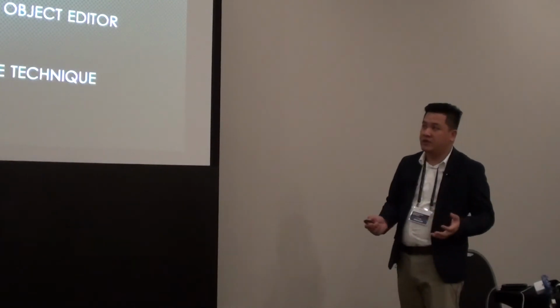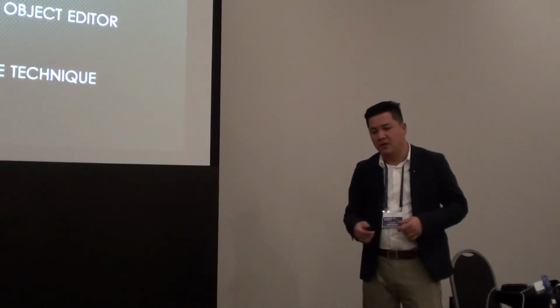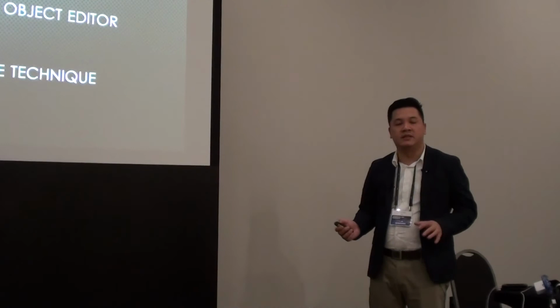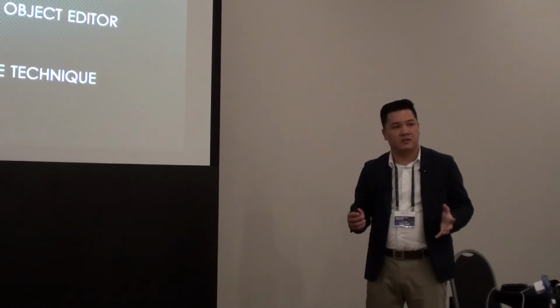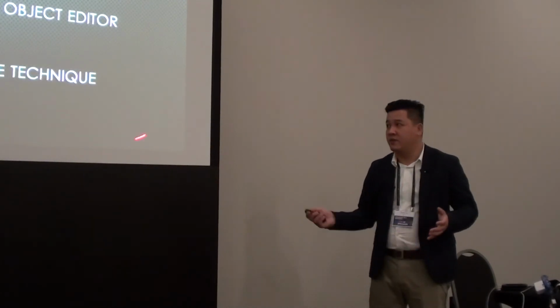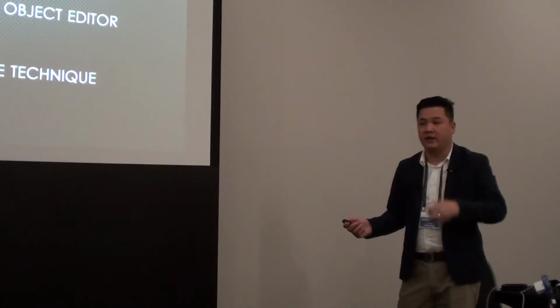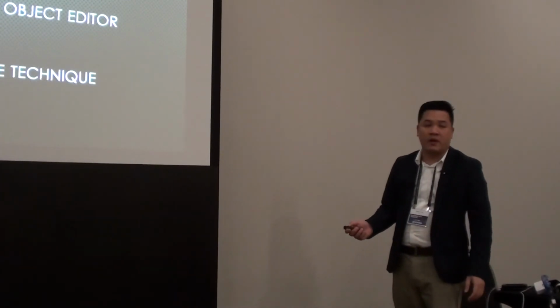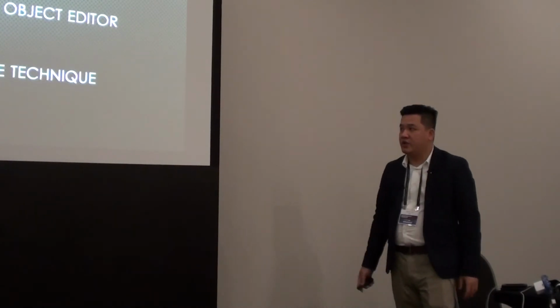So one of the modules that I use for that, of course, is the Copy Denture module, which was introduced in 2019 by 3shape. And it's one of my favorite modules because previously with 3shape, the only thing you could do was edit hollow objects, right? And if you tried to bring a solid object in, if you've ever worked with a Sirona model, it'll have it completely watertight, and if you try to bring it in, it'll throw an error at you. With Copy Denture, you're able to edit solid objects in 3shape.